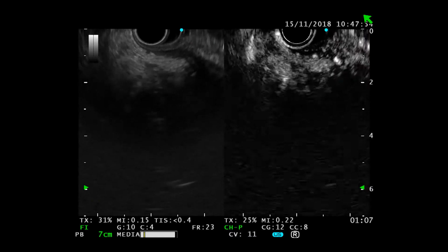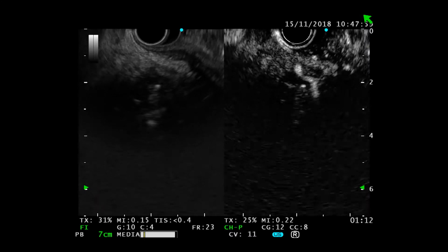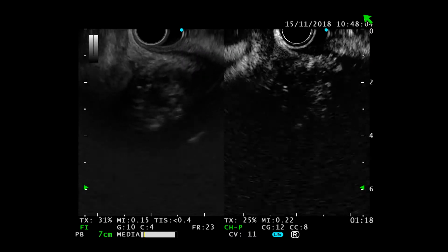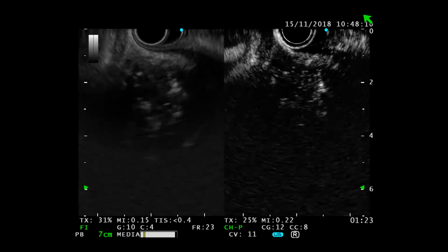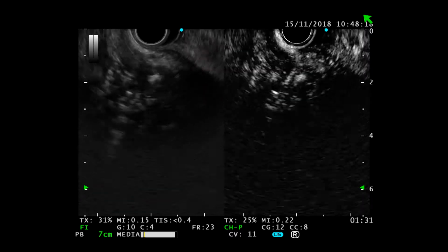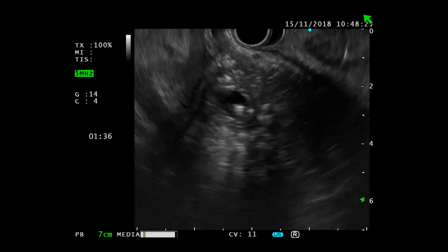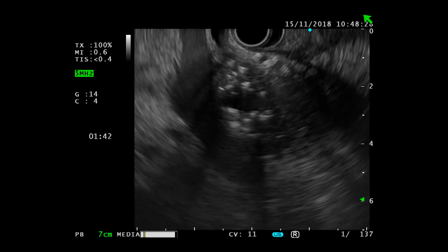But I think there is a difference between the area with a lot of calcification that takes contrast and the area where there is very little calcification and doesn't take any contrast. Luca, what do we expect from contrast exactly here? What I see is that this pancreas is not homogeneous, because there is an area with a lot of calcification and a mass without calcification. This mass doesn't take any contrast, the other part takes contrast. So for me, this is highly suspicious for cancer. And will it help us target the lesion? Armando.